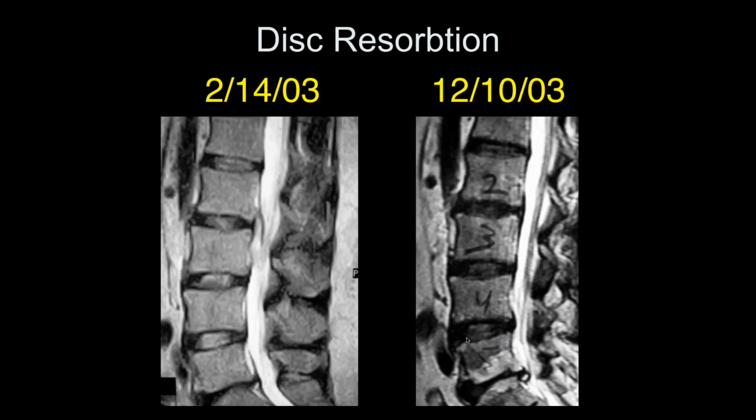Okay. Was it iatrogenic, like secondary to surgery, or? No, that was a hemangioma, and they went into surgery to remove the disc, and they found that it wasn't really a disc; it was just a hemangioma there. So here we can see on 21403 an extruded disc fragment on this image. And if you look at a follow-up about 10 months later, it's no longer there.